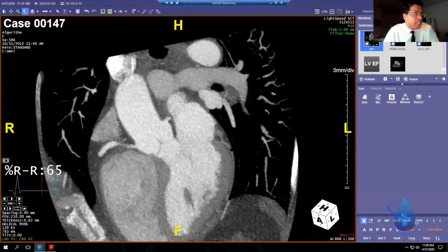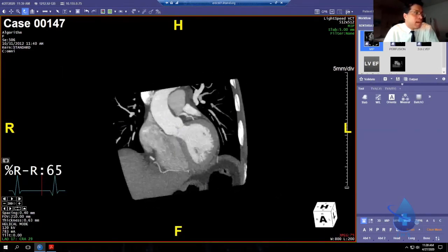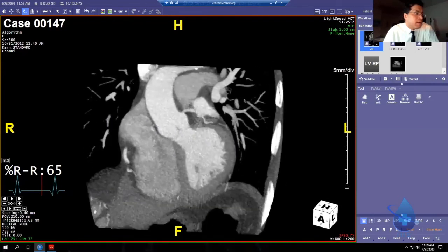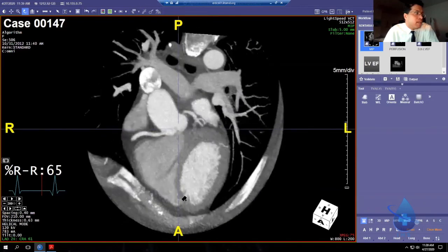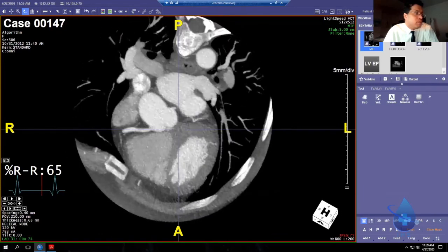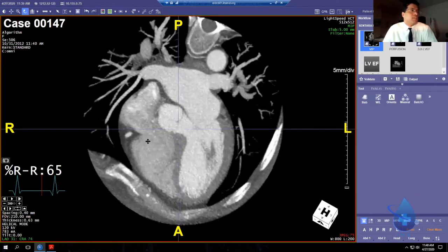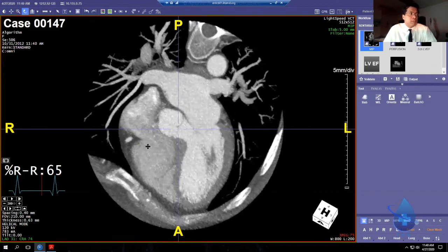So, for example, if I put the aortic valve in my crosshair, I'm not quite lined up, but if I put it in my crosshair and left click on the bottom of the screen, I can line up the LAD along the blue lines. It doesn't have to be perfect, but in doing so, if you look at the blue lines, the AV groove is more or less along the horizontal, and the interventricular plane is more or less along the north and south plane.